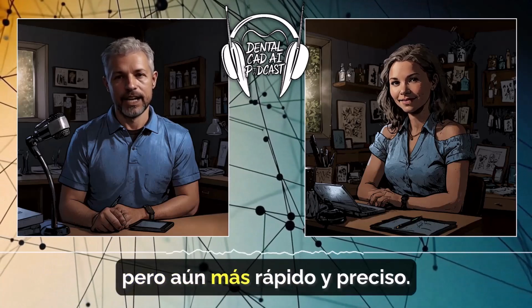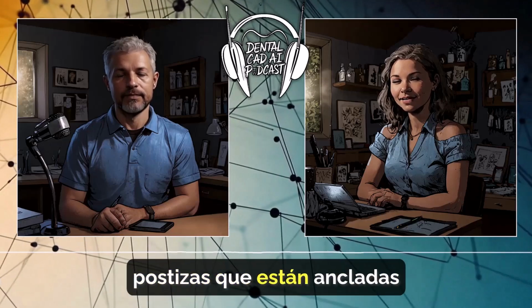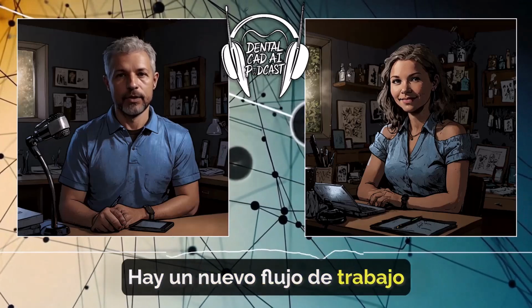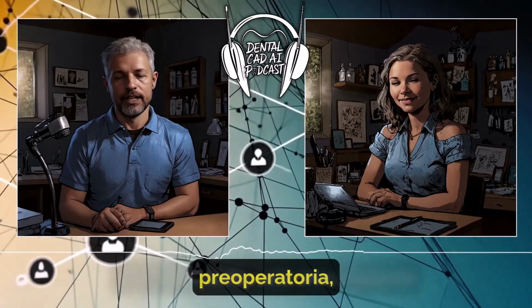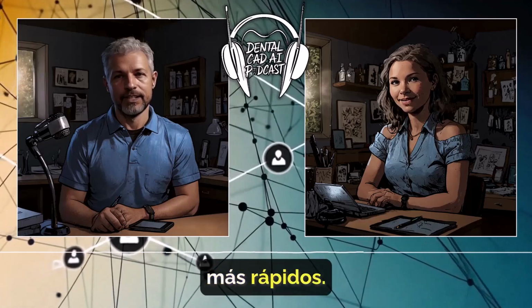Kinda, but even faster and more precise. That's incredible. Okay, so what about those dentures that are anchored to implants? They've got that covered too. Oh, really? There's a new guided workflow for overdentures on ball attachments. Okay. And it allows for preoperative manufacturing, so everything's ready to go when the implants are placed. So quicker recovery times? Exactly.